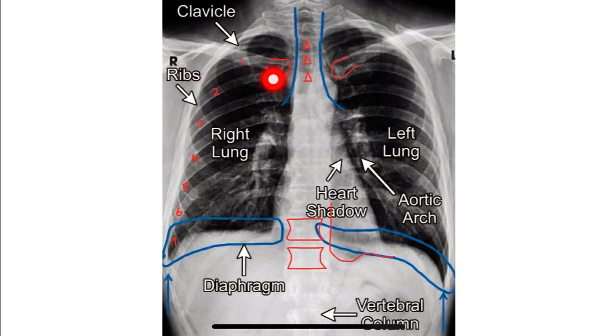These are the anterior ribs and posterior ribs forming the rib cage. There are 12 pairs of ribs. This is the diaphragm. It separates the thorax from the abdomen. It is innervated by the phrenic nerve, root value C3, C4 and C5.